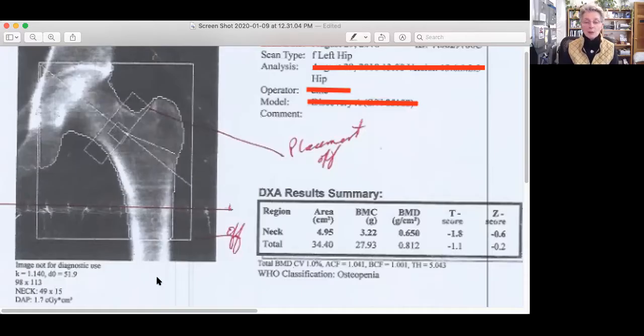I've seen many cases where people think they're gaining, they're on groups and Facebook and so forth, claiming that they've gained 10%. And if it's in the hip, I already know what's happened. There are other errors that can do it too, like the rotation of the hip. But for now, we're going to talk about this particular one that we have in front of us.